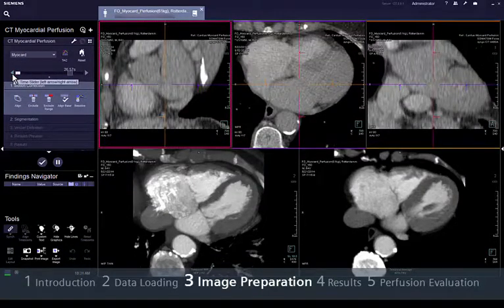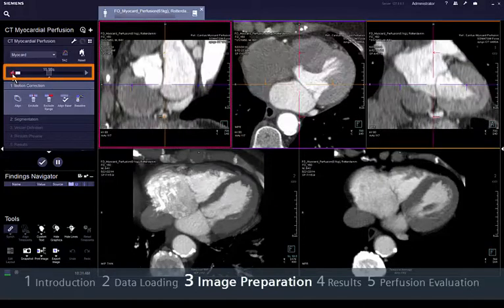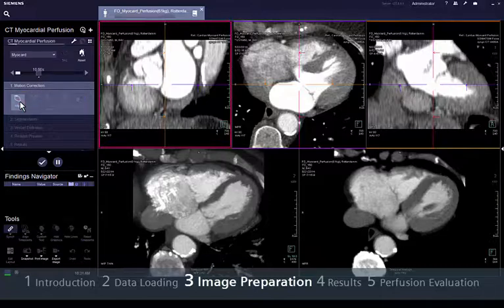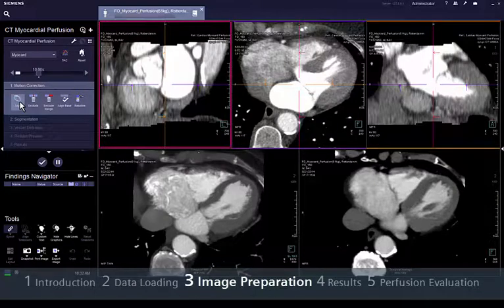The first step of our workflow allows motion correction. Just scroll through all time points to detect a good time point with minimal motion that could be set as a reference. Notice how the small triangle changes, and click the Align button to apply motion correction. If motion artifacts are observed in some time points, it is better to remove the corresponding points beforehand.